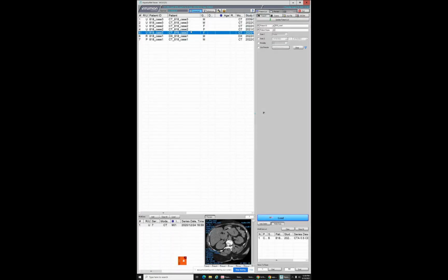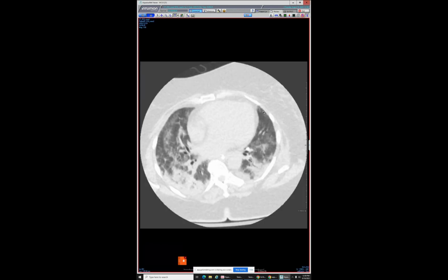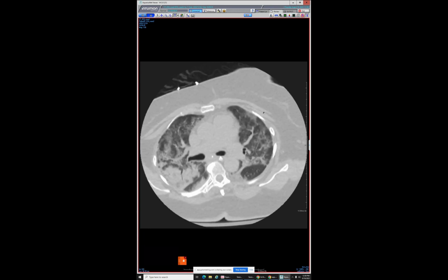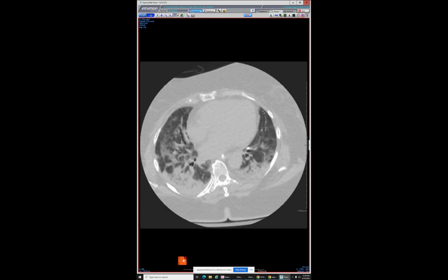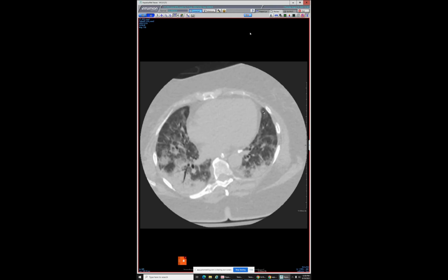Wow. Which case is this? I don't remember. Oh, I like this case. I enjoy this. So here's a patient, nothing groundbreaking, but I just liked watching the evolution of these things. So this is during COVID, right? So early, patient comes in short of breath, COVID, somewhere in the acute lung injury spectrum, probably DAD, but maybe OP.